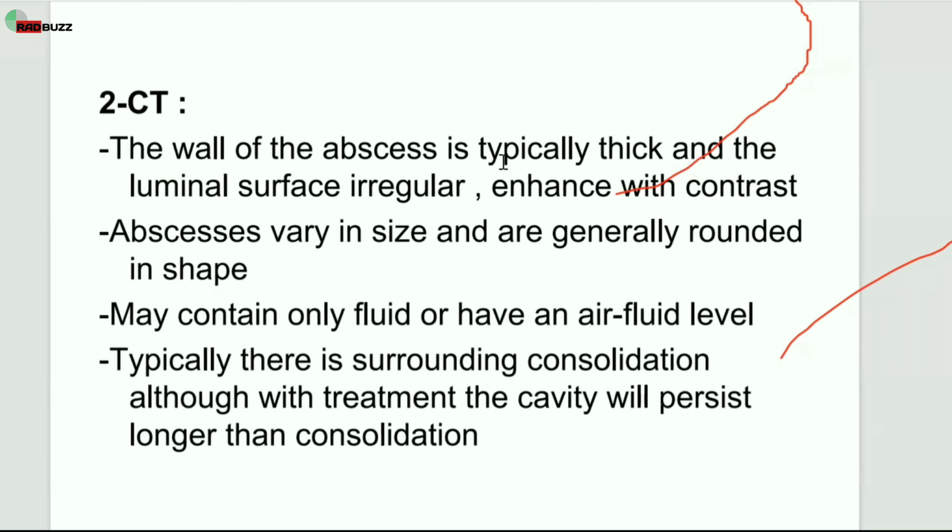On CT, the abscess has thick walls and an irregular surface. It enhances with contrast. So whenever, as I said before, infection is a query, go for CT with contrast. They vary in size and are rounded in shape, usually with only fluid or an air fluid level. Initially, they have only fluid whenever there is pus.